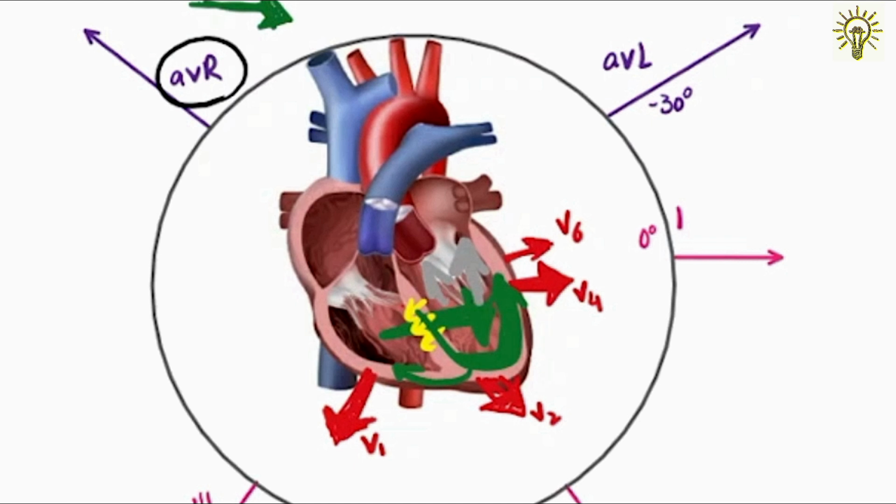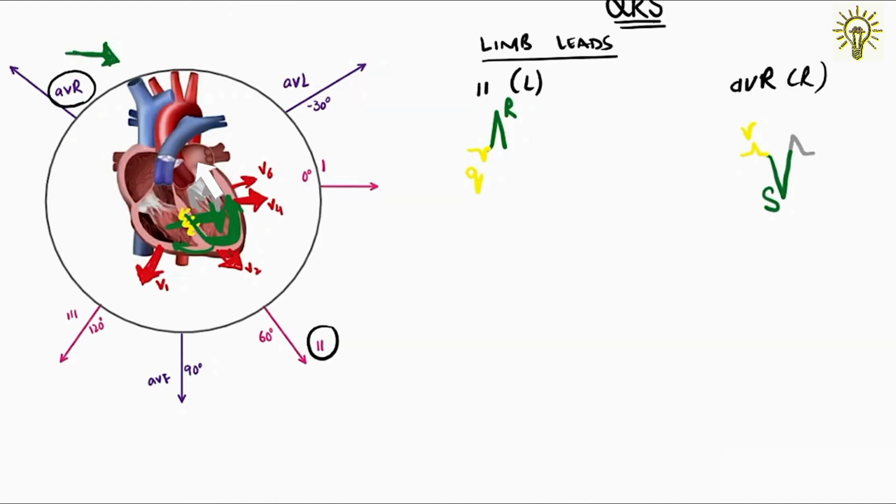The third part of the ventricular depolarization wave is the one from the basal parts of the heart, which is directed upwards and backwards. This causes a negative small s wave on lead 2.